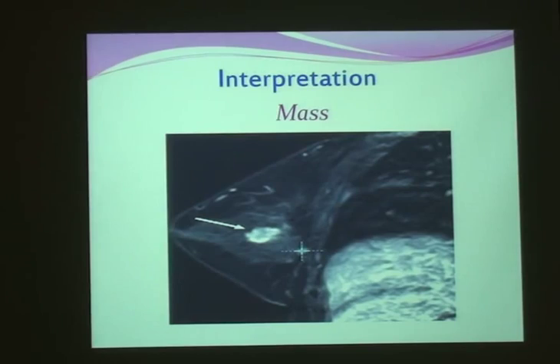And then, this is the most important part here. I've done the breast MRI and I got a lesion. How can I analyze the lesion? First of all, we just split it into major categories. We will assess in 2 ways: morphology, and the enhancement pattern and signal intensity curve.